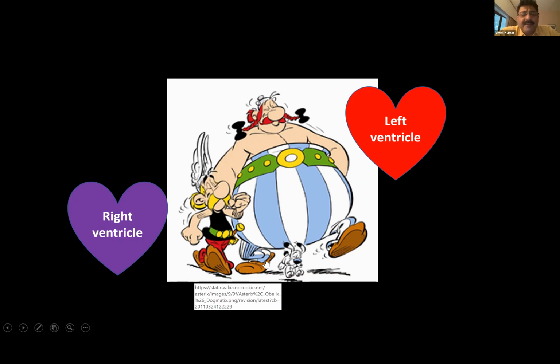So you have the left ventricle, the right ventricle. Anyway, anybody? I think it's the right ventricle. No, so this is the left ventricle. This is the right ventricle. I'm talking about, what is this? What does this represent? The dog which is running away, or the fear of being crushed.